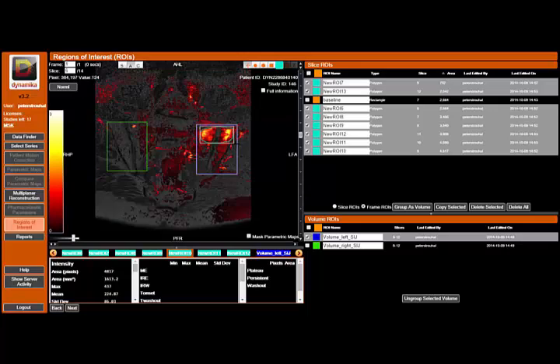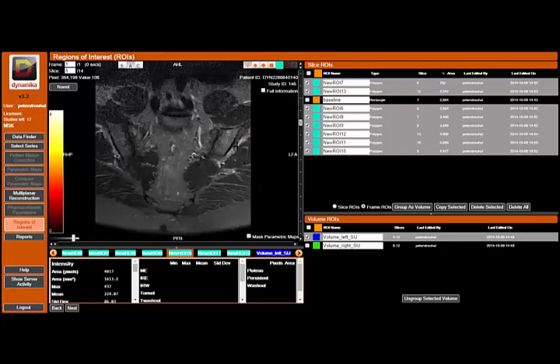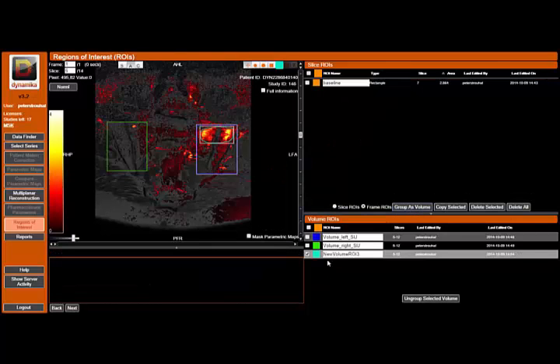The clinical significance of the larger regions of interest around the sacroiliac joints can be correlated, as I mentioned, to isotope bone scanning. So we have an understanding already that the peak values and average values within the joint-related regions of interest can have a definite clinical significance because you can highlight the abnormal joint.